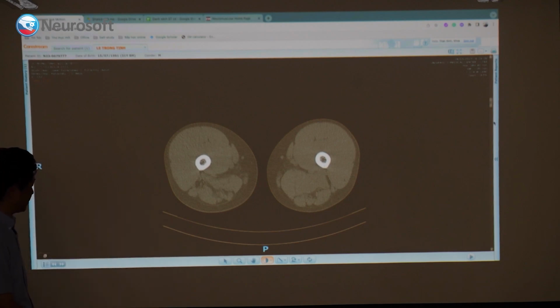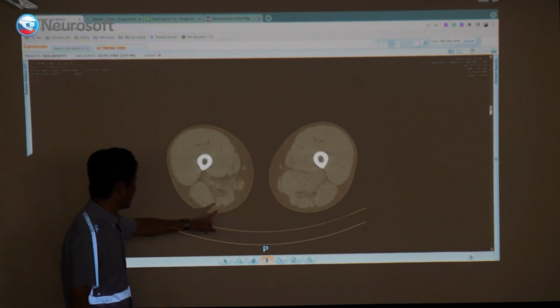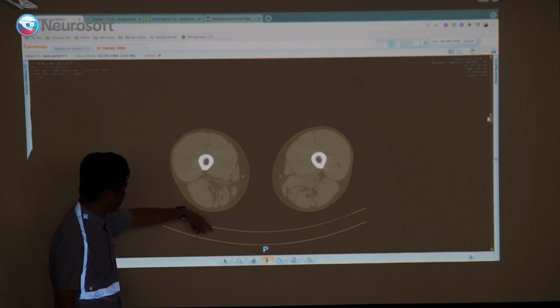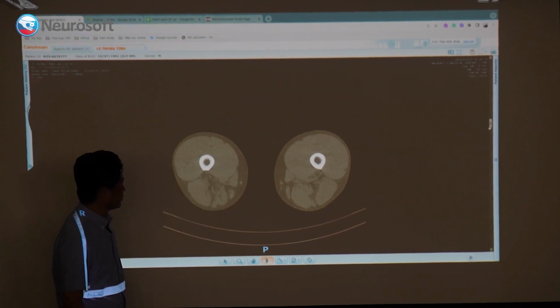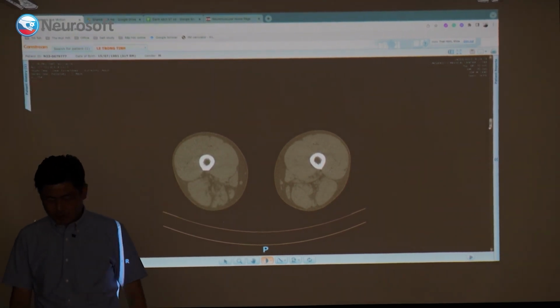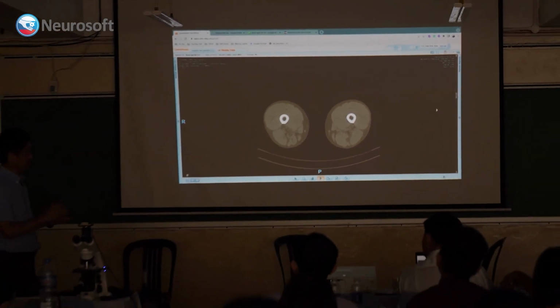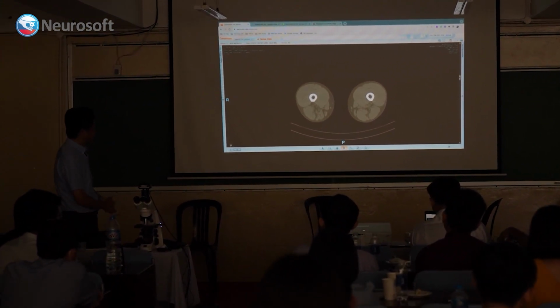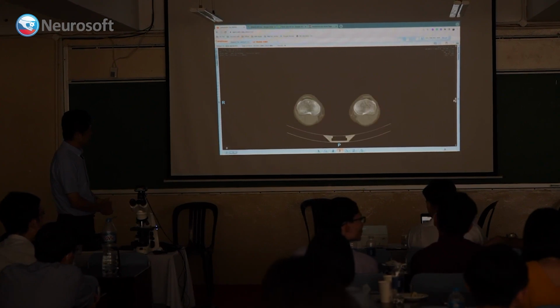Can you go down further? Nếu mà GNE myopathy thì cơ kép lớn here, và cơ semitendinosus is a little bit affected, but not much. But here, can you go down further? Yeah, probably this is semitendinosus and also adductor magnus is affected. If this is really in early stage of GNE myopathy, maybe okay. But tibialis anterior is already all gone, right? I think this is not compatible. Nếu mà giai đoạn sớm của GNE thì cái này chấp nhận được, nhưng mà không phải giai đoạn sớm đó, tại vì chúng ta thấy là cơ chạy trước nó biến mất hết luôn rồi.